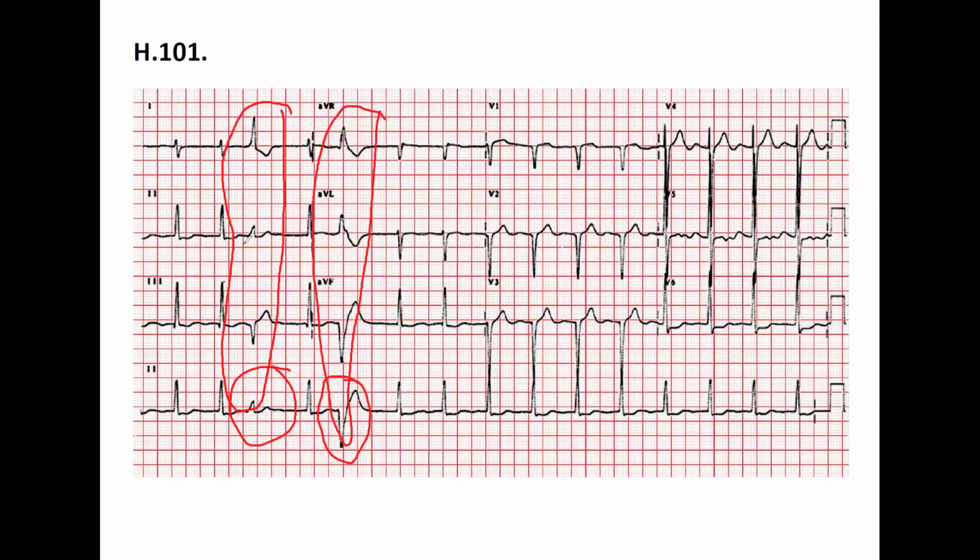So basically you can see that these beats come earlier and it looks like a ventricular beat. That's a ventricular premature beat. Mostly it's rhythmic, but we do see a ventricular premature beat. So in this case, you can say that this is a mostly rhythmic ECG that is interrupted by some ventricular premature beats. Okay, good.